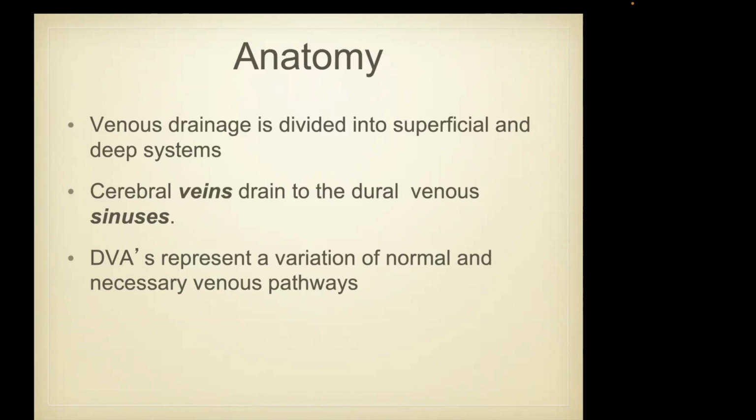I think some scanners allow you to do a slightly off coronal oblique, and some people think that's a little better, but in the end, whatever plane you acquire, you're going to have some segment of the veins you're not going to see well. There are two ways to get around that. I'll touch on one of them later: you can do the venogram after you give contrast, if you're giving contrast, or you can do two acquisitions. If you do an axial and a coronal acquisition, you're pretty much going to cover all of the dural sinuses on MR venography. Thank you very much.